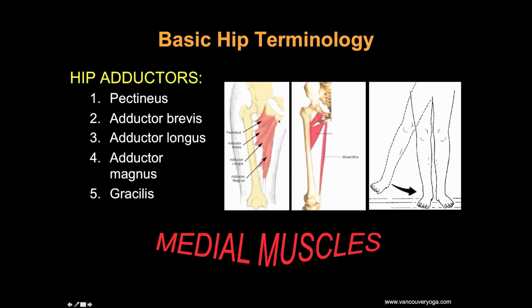The adductor longus will attach to the pubic tubercle along the anterior margin of the pubic body, and it will be continuous with the rectus abdominis to form the rectus abdominis adductor longus aponeurosis. And this is an area of injury commonly known as athletic pubalgia or sportsman's hernia.